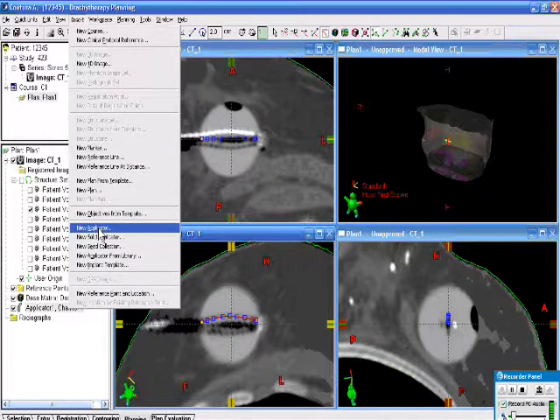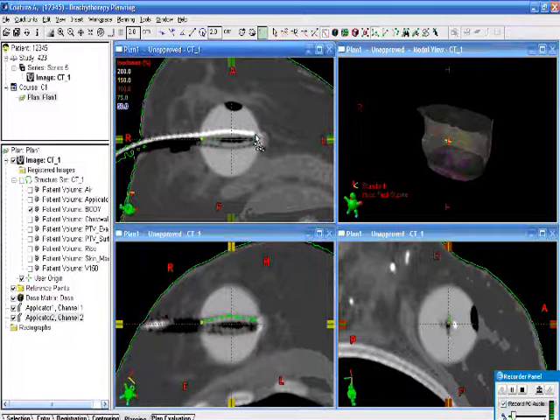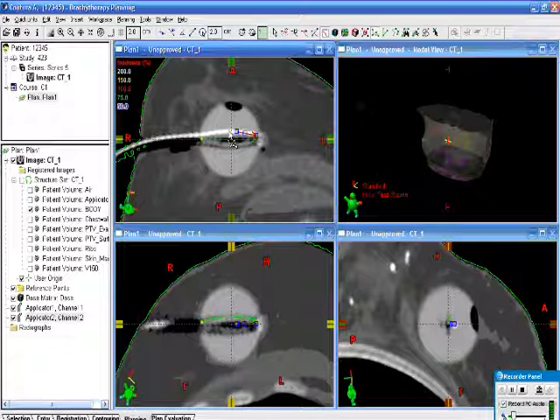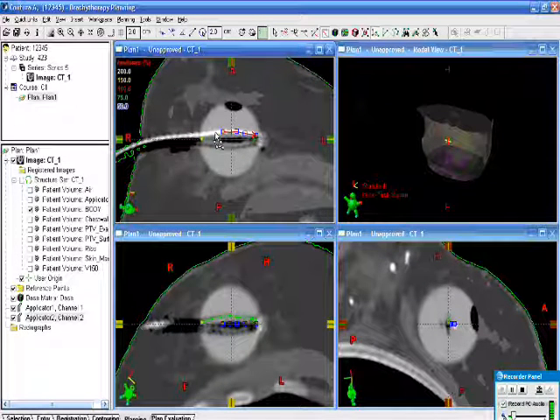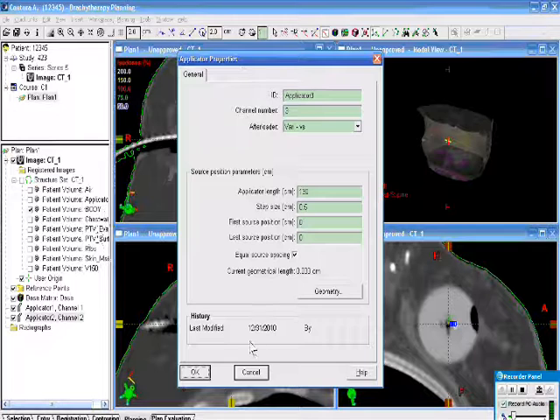We'll go and we'll do number 2. Here's number 2 that I tried to reconstruct the first time. Now since this wire is actually in the lumen, we want to reconstruct right over the bright spot there, and to about there. Number 3.